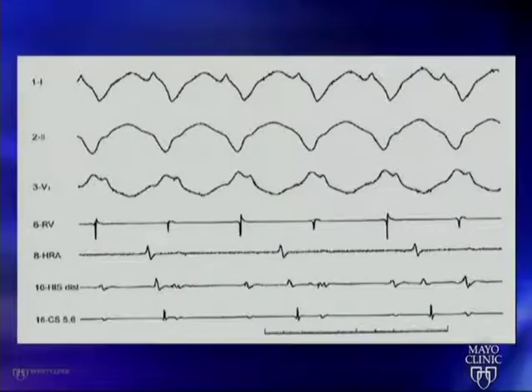Now take a look at this one. You'll hear in some talks about how you can use the EKG to tell whether it's SVT or VT when you have a wide complex rhythm. And actually it can be very hard. Even after doing it hundreds of times, you make mistakes. But for intracardiac tracings, it's extremely simple to make this distinction.